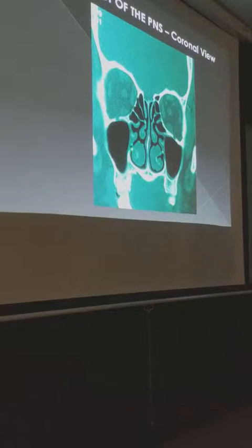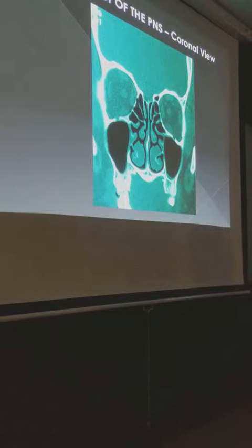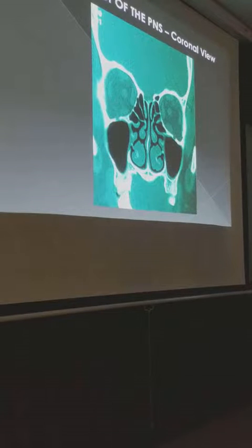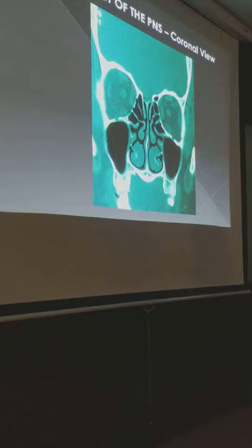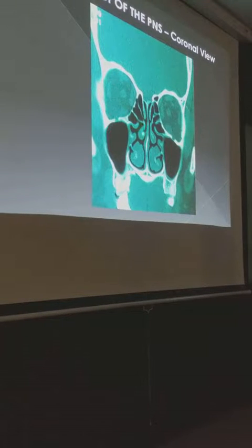What is this? Kung may horizontal, may perpendicular. Diba? So, diba sabi ko sa'yo, sa dulo, yun yung lagi nyung naiiwan pag nag-uncinectomy kasi ang tigas ng buto na yan. But it's consistent. Diba? It goes down, ethmoidal process of the inferior turbinate, then perpendicular plate of the palatine bone. So that's your pinaka-posterior inferior portion na yan. Kasi diba sickle? Ganon.